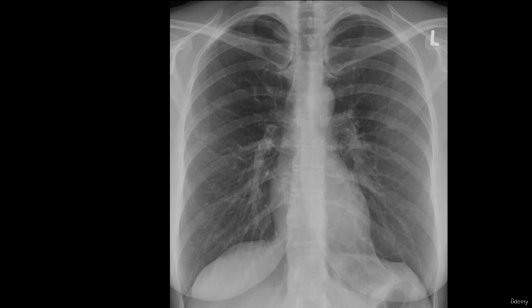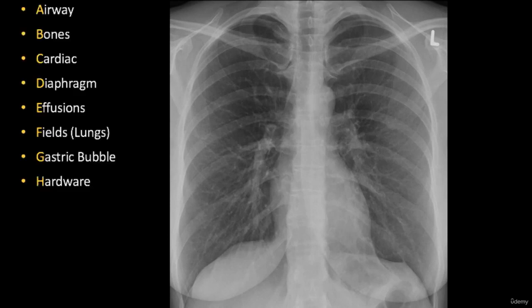The evaluation of the thorax traditionally begins from the X-ray. It allows us to see how symmetrical the structures are and gives us some clues about what we should point our attention at in the future. To read the X-ray of the thorax, we need to know how a normal X-ray of the thorax looks, right? It's always easier when you have a plan in front of your eyes. And this algorithm that usually is followed by radiologists is here on your screen.